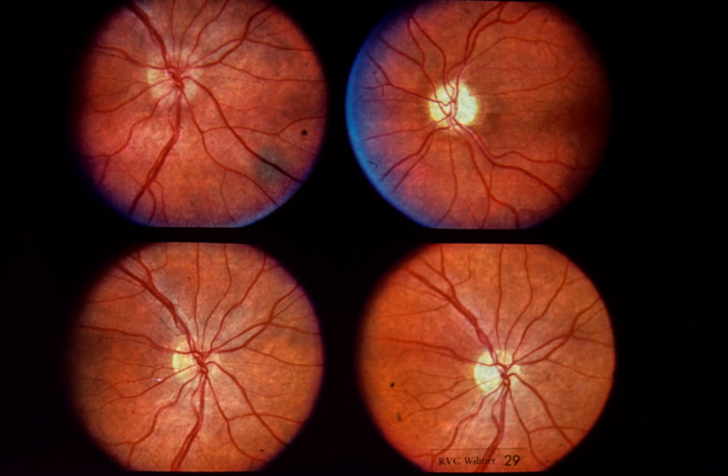Lower left. After 2 weeks of steroid therapy, the right optic disc is no longer edematous. Visual acuity is 20/200. Lower right. 2 months later, visual acuity has improved to 20/40. Color vision remains defective, and there is a small central scotoma. The optic disc has definite temporal pallor.